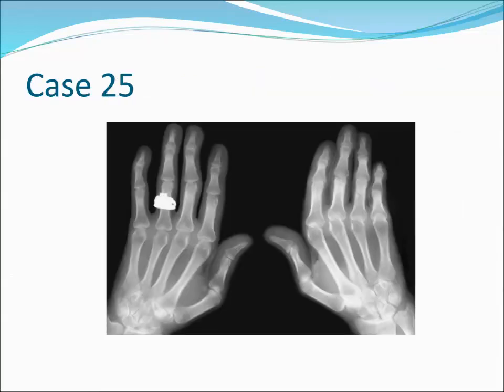This is a case of systemic lupus erythematosus. Marked soft tissue wasting, as noted by the concavity in the hypothenar eminence, and ulnar deviation of the phalanges, as is seen primarily in the right hand in this patient, are hallmarks of SLE. The striking abnormalities in the hands in each of these disorders are osteoporosis and soft tissue wasting. SLE characteristically has severe ulnar deviation of the phalanges, as shown in the above case. Erosions are generally not present in these diseases.